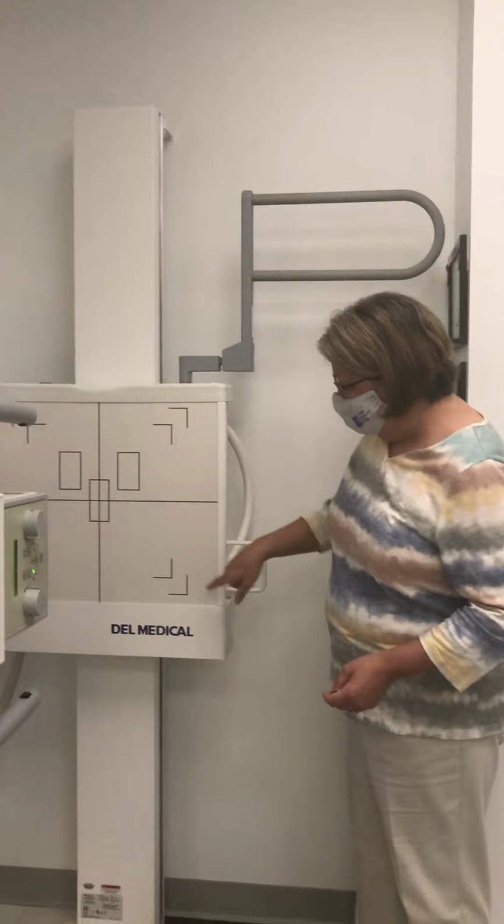Next is the erect abdomen. This is an image of the erect abdomen. What do you notice? What stands out to you, even if you don't know anything about radiographs? This is an indication of an air fluid level. This is air, and below this point is fluid. So, that's your air fluid level. The erect abdomen allows us to demonstrate an air fluid level.